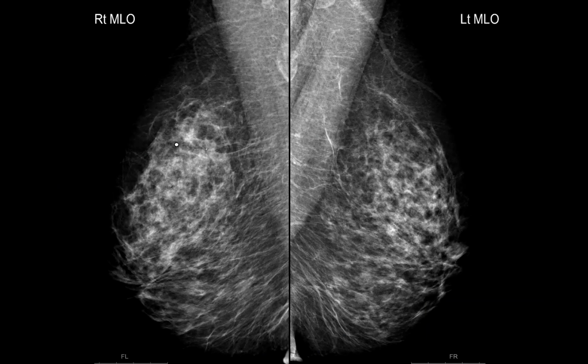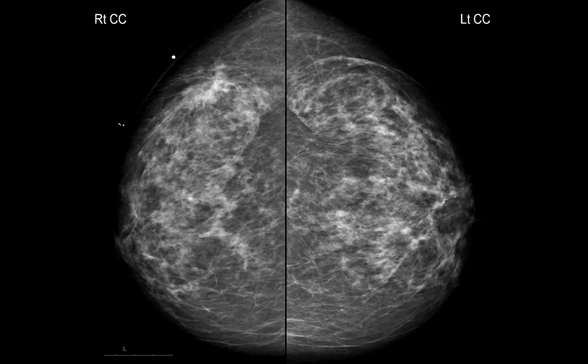And then I say, oh, thank you very much that you found it, because she put her finger here. Do you see something very different? No. But on the CC projection you do. This is an architectural distortion. Palpable architectural distortion is either cancer or cancer.